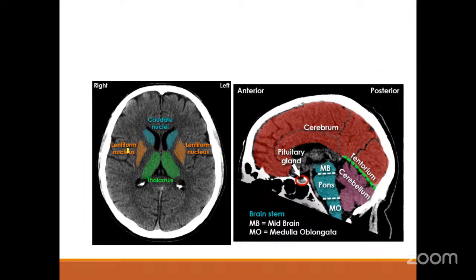The gray matter lateral or outer to the external capsule, just under the sylvian fissure, we call the insular cortex. So from the periphery, we have the skull, then the CSF space, then the cortical gyri, and close to the sylvian fissure we have the insular cortex. After the insular cortex, we have the external capsule, then your basal ganglia. In between, you have the internal capsule crossing over. Deep to that is your ventricular system, and the same from the opposite side. Any pathology affecting these structures causes the differentiation between them to get lost, which I'll discuss in the coming images.